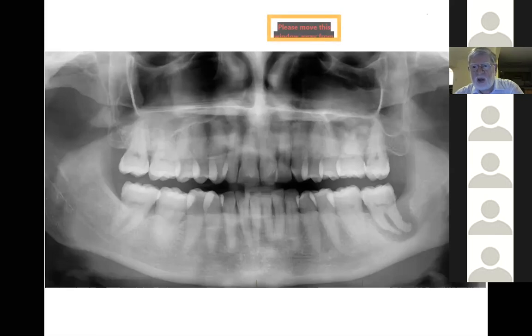So what I'm going on about is if you ever see something like that, just be very careful. Be warned, don't go in too lightly and think, okay, look, I'm going to take this tooth out. Rather refer the patient to an oral surgeon, particularly in this mouth where there's an enormous amount of bone loss there. There's absolutely nothing remotely like that elsewhere in the mouth. So you've got to question why this has happened, what's unusual about it? Please refer on to the oral surgeon for something like that.